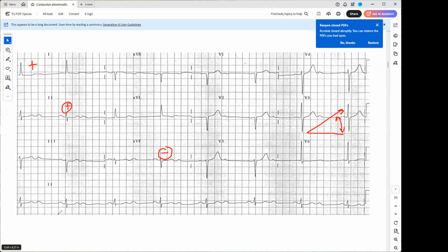And then I looked at the P wave and the PR interval, which is constant throughout, around 0.2. It doesn't matter how big the PR is here because not every P is conducted. This is not conducted, conducted, not conducted, conducted, and it's rhythmically coming and the rate is rhythmic. So this is a 2:1 AV block. Very good.